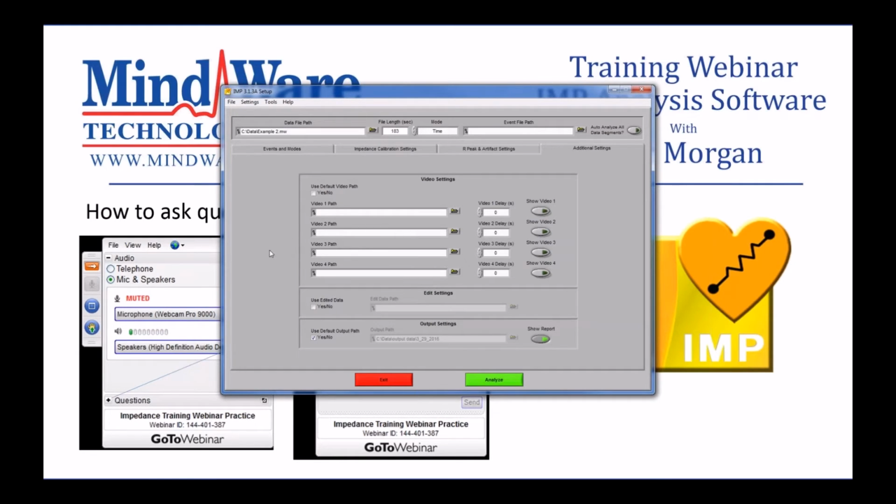these paths. If for whatever reason you renamed your files or you moved them to a different location, or if you're using a third-party video acquisition system to acquire your videos, you might need to come in here and do it manually. So all you do is come in here, and from these paths, you select your video files, and you choose Show Video. And when you do so, you'll see your videos either show up embedded in the analysis screen, or if you have more than one, it will show up in a floating window outside of the analysis screen. And there's also this video delay box.